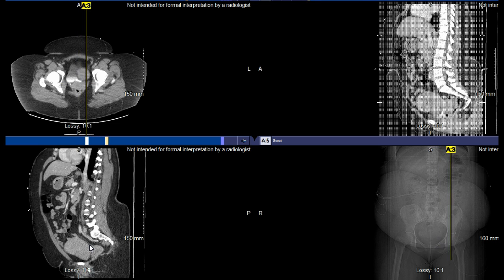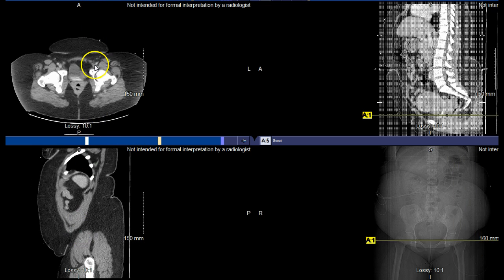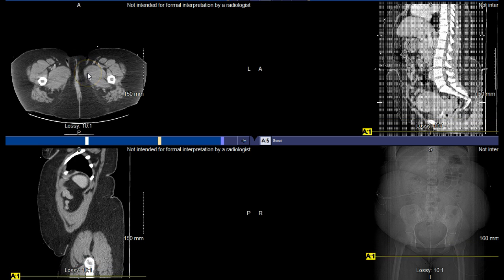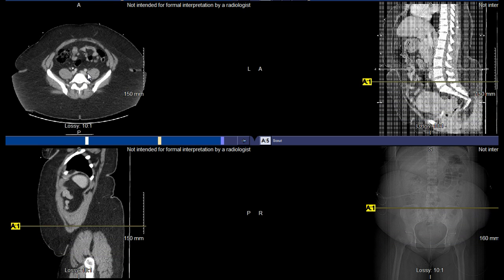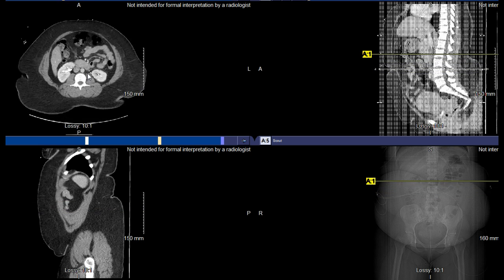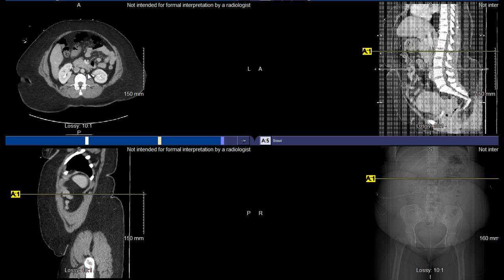So utilize the planes. The planes all help. That's why we have these additional planes. That's why we don't look at things purely in sections, but rather we can see comprehensively from top to bottom. So in a nutshell, that's a rundown of some of the female anatomy that I want you to know, and really those important structures were mentioned from start to finish.